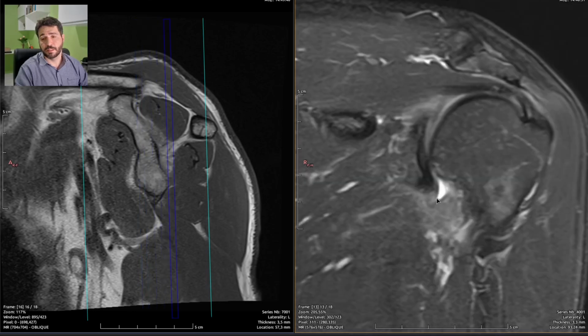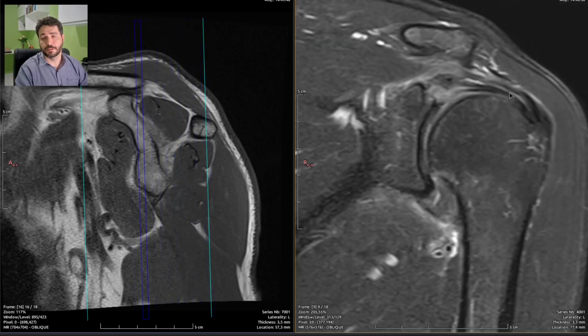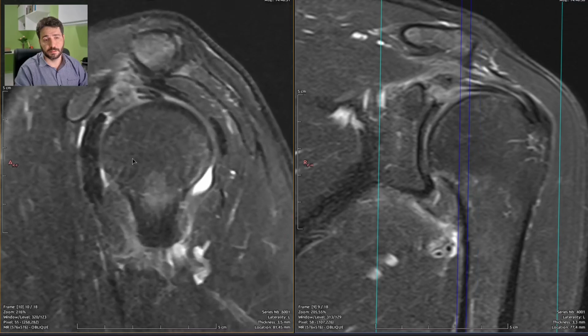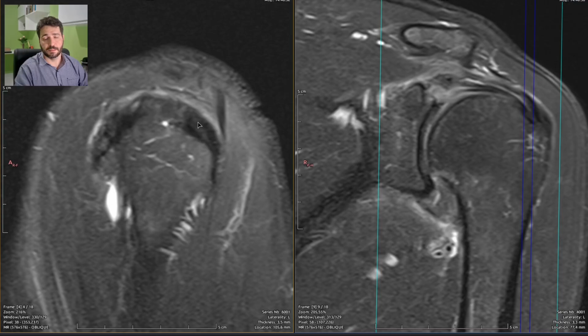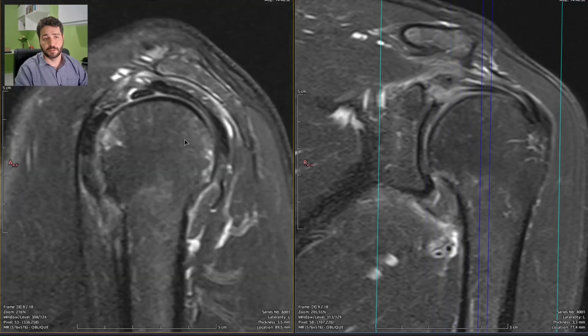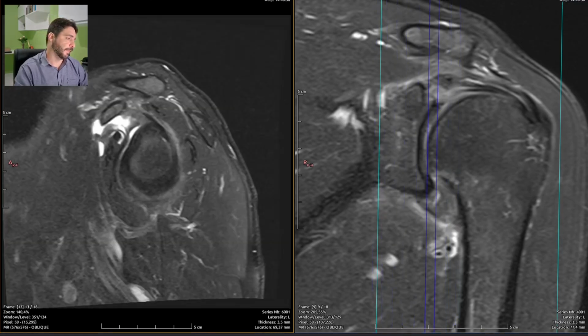This is articular effusion, and this is the ruptured tendon, which can better be seen right here. This is ruptured, this is disease, and this is also disease, and this is mild arthrosis of the acromioclavicular joint. So we have done it. It's reported, we won. So let's sign it off.